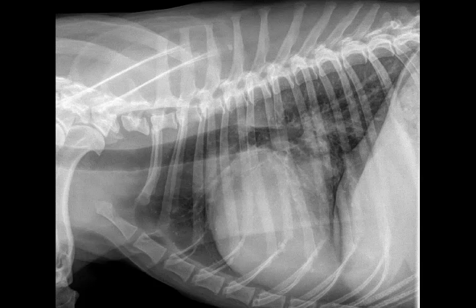All right, so we're going to do a quick demonstration on how to do a vertebral heart score evaluation on a canine thoracic x-ray using HeskaView Plus. So we have our right lateral x-ray up here. I did change the window leveling a little bit just to make it more contrasty. This helps find and define the vertebral bodies better as well as the heart. So don't be afraid to add more contrast with your window leveling tool.